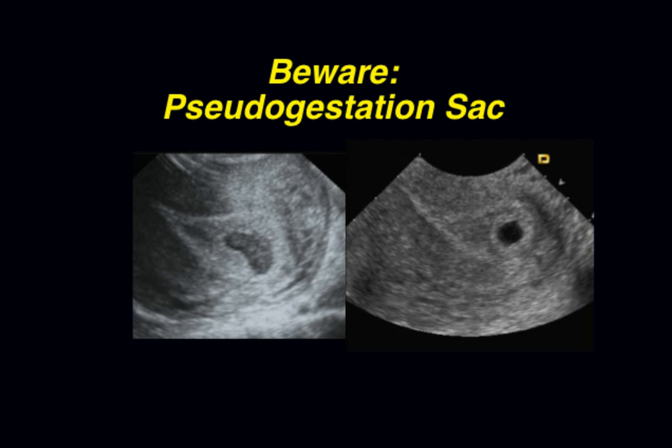As I previously stated, it is currently unlikely that one mistakes a pseudogestation sac as a normal pregnancy. It is much more often mistaken for an abnormal intrauterine pregnancy. As I noted earlier, this mistake is equally problematic because the operative words are intrauterine pregnancy, not normal versus abnormal. The example on this slide was misdiagnosed as an abnormal intrauterine pregnancy, leading to a malpractice litigation. Again, we must be rigid in the criteria we apply to the diagnosis of intrauterine pregnancy.